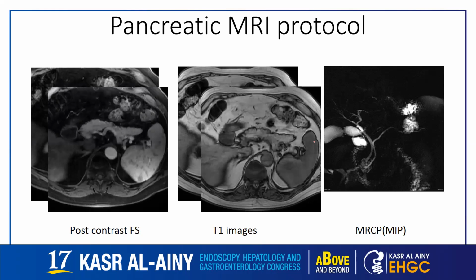And this is a higher level of the pancreas, where we can see in this case there is a pancreatic bifidum, where the pancreatic tail is divided towards the spleen.